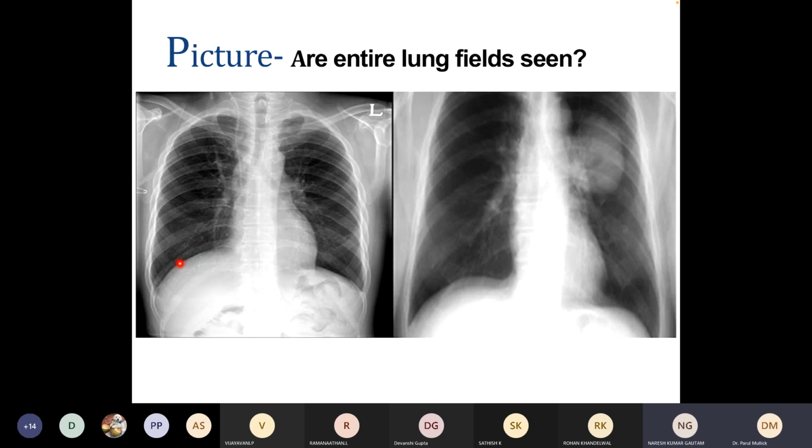Okay, फिर दूसरी वाली में जो उसके साथ है, मैम apex कट है उसमें, apex नहीं दिख रहा, apex भी कटा हुआ है और left जो है costophrenic angle भी पूरा नहीं दिख रहा. तो ये वाली complete नहीं है ना. So it is important that it should be a complete picture. तो इस X-ray की picture quality is not good, है ना. इसकी quality कितनी beautiful है.